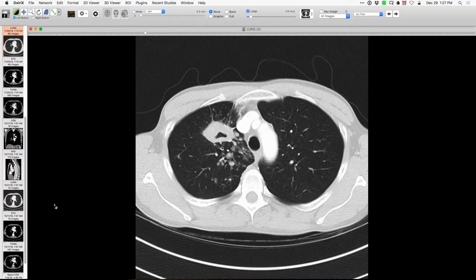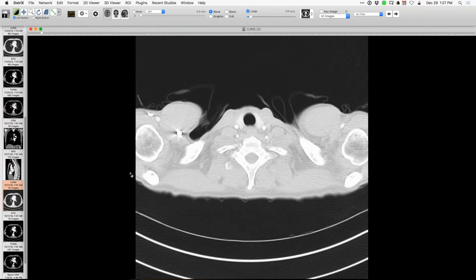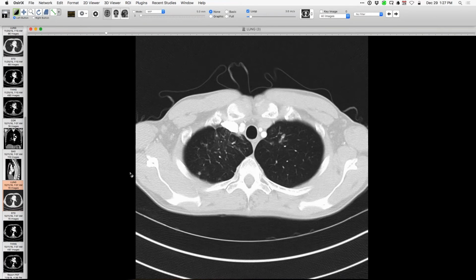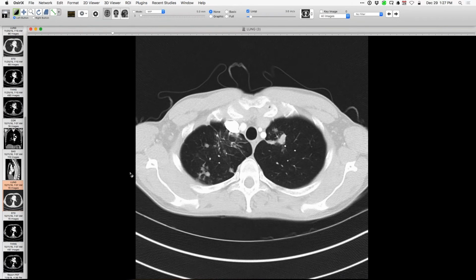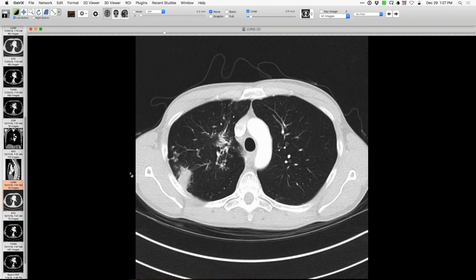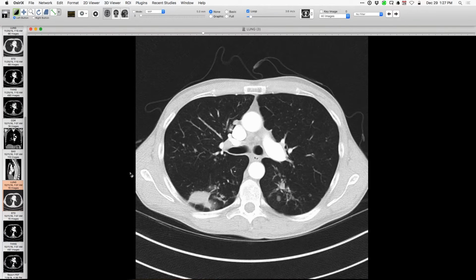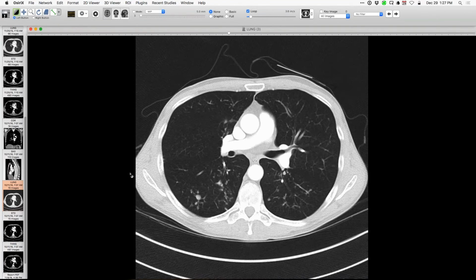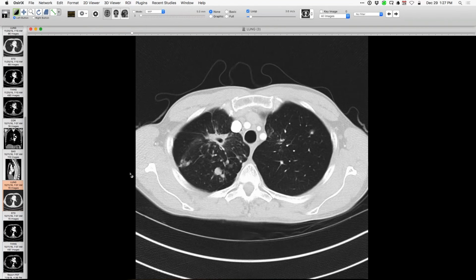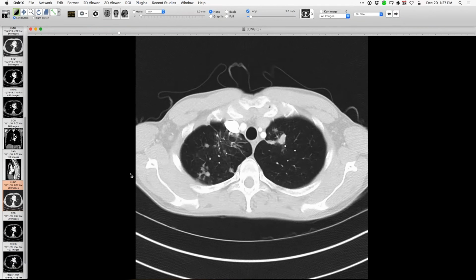At the time of the symptoms, this year, we now have that lesion, which is actually a bit smaller, but now we have new lesions, one up in the left lung apex, and new lesions here in the posterior segment, and additional ones in the right lower lobe. So I was really concerned about tuberculosis, and this person did turn out to have sputum-positive TB.